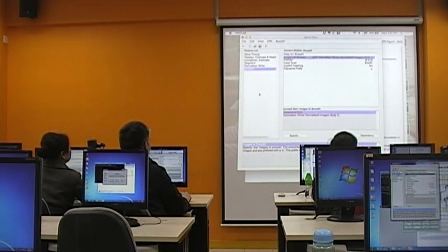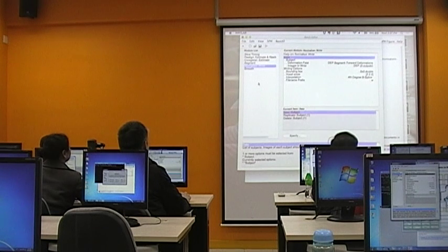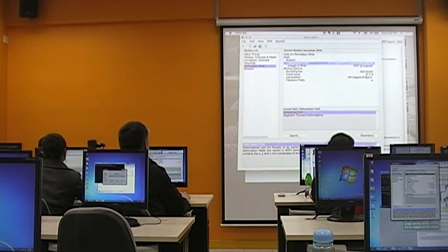So after segmentation, remember we are having some parameters for us to normalize the individual image to the template. So now the fifth step here, which is normalize, right, exactly does that. So first of all, you need the deformation field again. So this is from the segment.